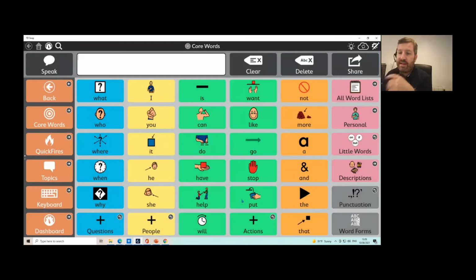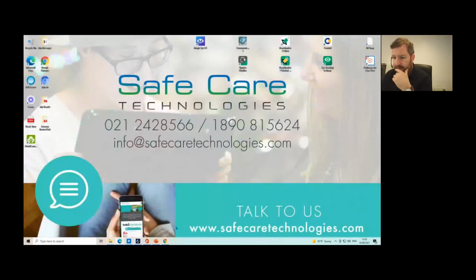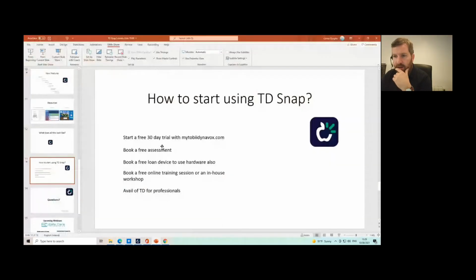So that'll always keep you up to date on what these new features are, and you can always check in with ourselves or on our website as well. Let me see where the PowerPoint was.